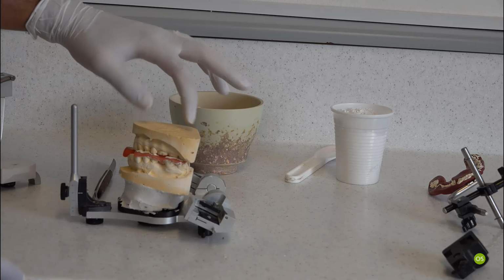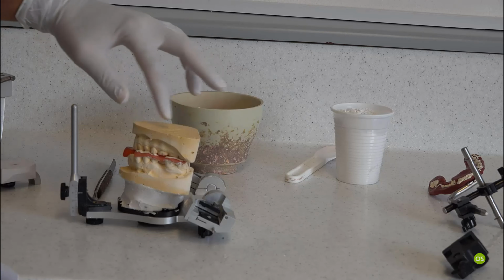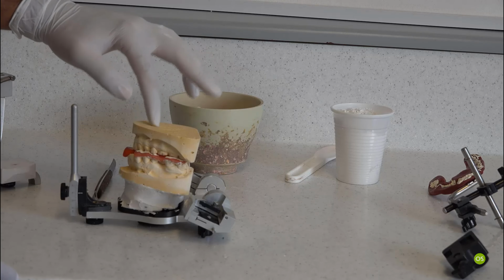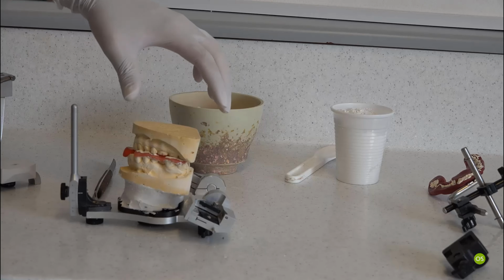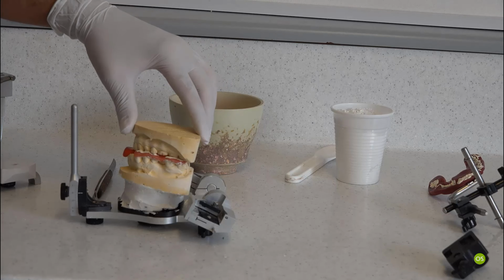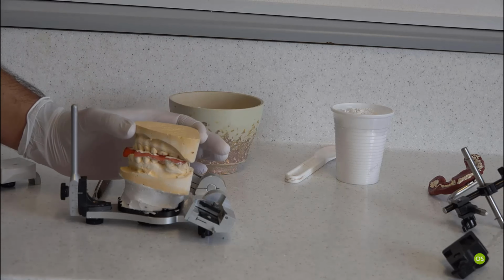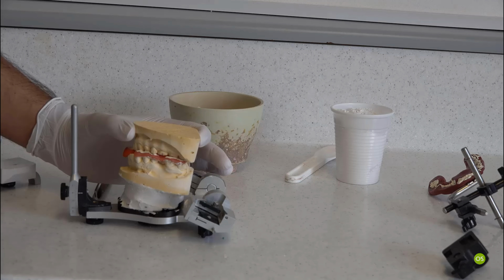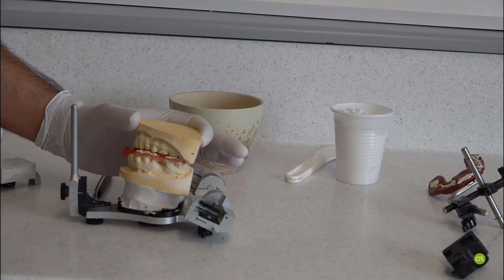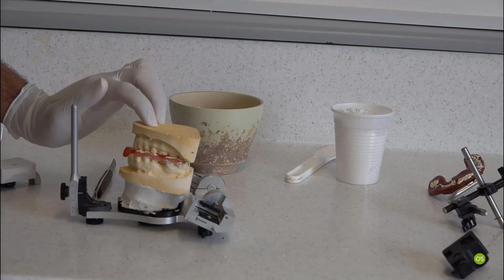I'm also checking if it's wobbly. So if I put too much pressure, it wobbles here, but otherwise it's not too bad. As far as it's stable within there, it's okay. If it moves a lot and it's not in a stable position, then when you're mounting, you'll have to hold the model down until the plaster sets, so maybe 5 minutes or so until nicely solid. Otherwise, if the model mounts like this, then your mounting will be wrong. But here it seems pretty stable.